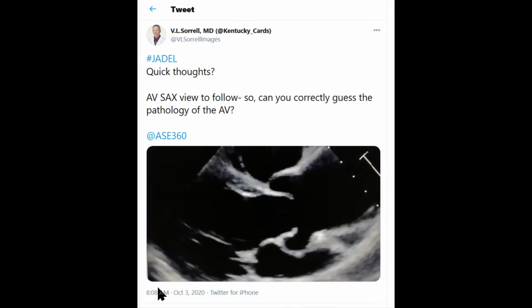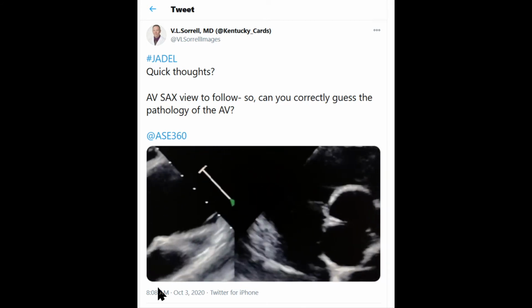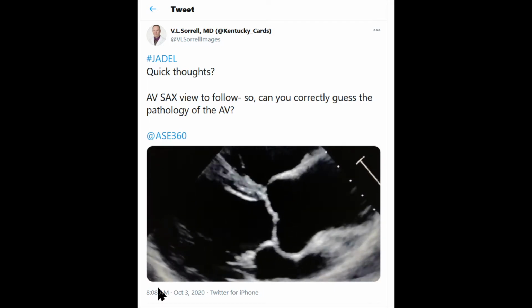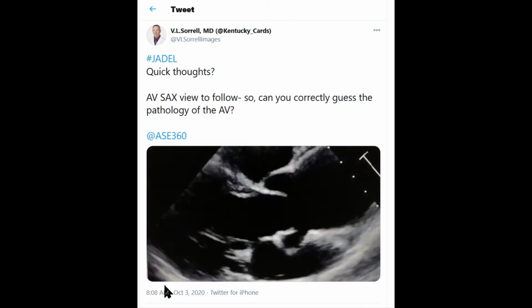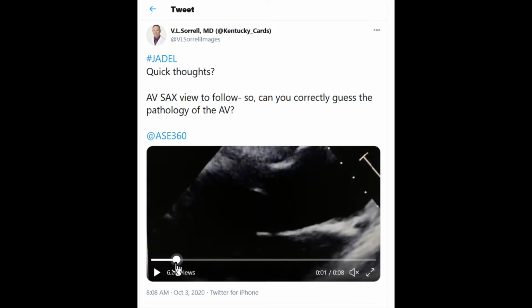Another video that was on my Twitter feed received greater than 50 likes. It's had a very long discussion from multiple people, and I thought it was worth bringing over to my JADEL TV channel. As you can see, I showed the long axis view of a parasternal long axis, and there are a couple of things that I'll try to point out here.